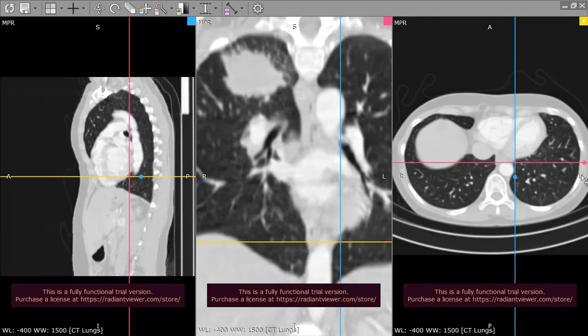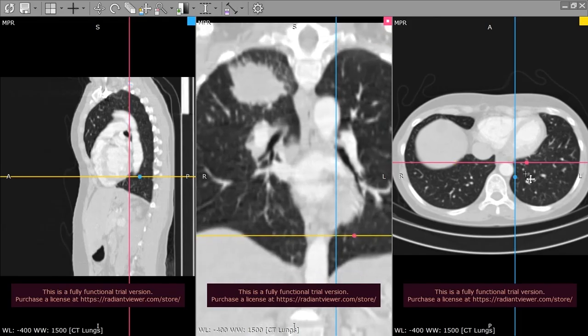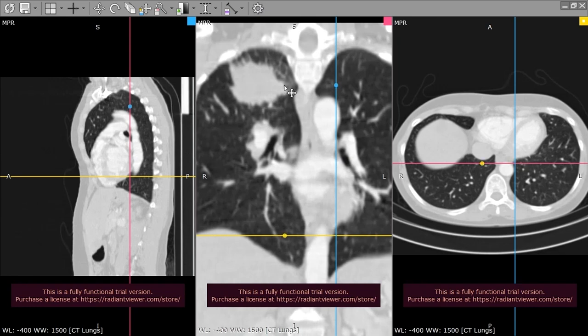Then let's go to the lung window to see the borders of such a lesion. You can see the lobulated border of such lesions with spiculated reactions and this small spiderweb appearance, or what's called pleural tags. It is a sign of aggression of the lesion.